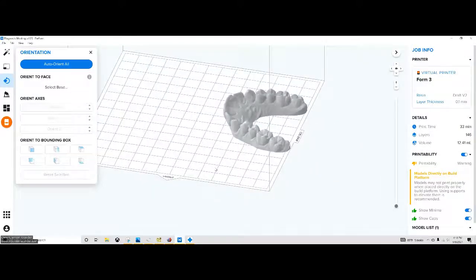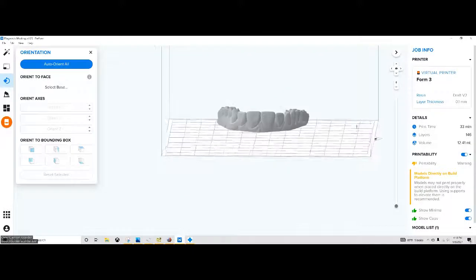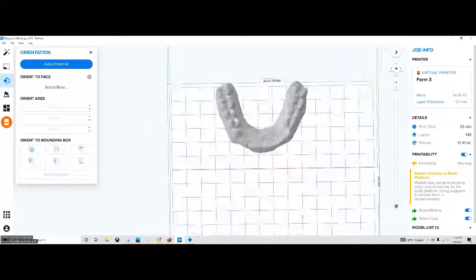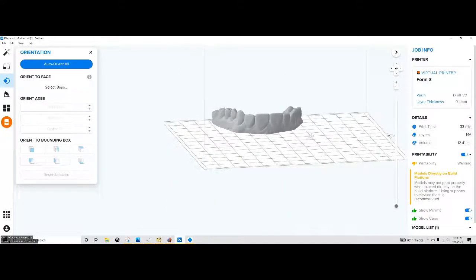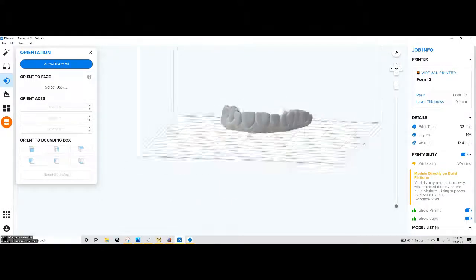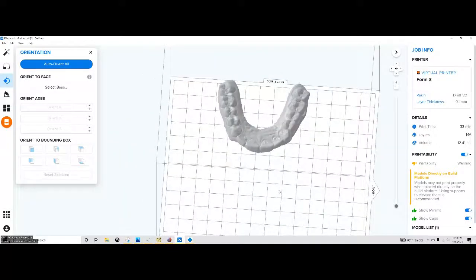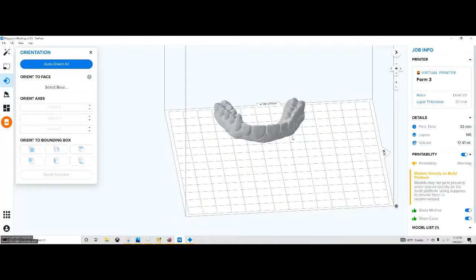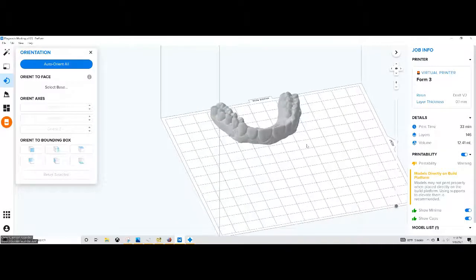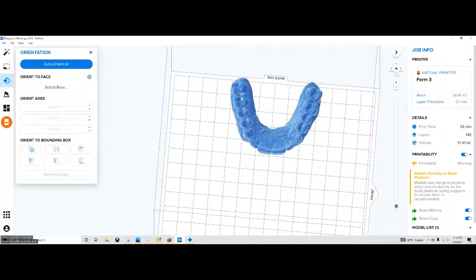If you calculate out your resin cost, this cost me about $2.40 to do this digital diagnostic wax up. So we just went ahead and did 4 teeth, and we have our print ready restorations in less than 20 minutes, and for a total cost out of pocket of maybe $3 plus 20 minutes of my time.